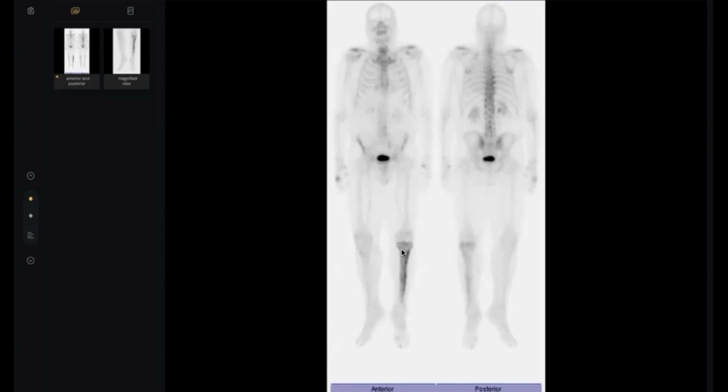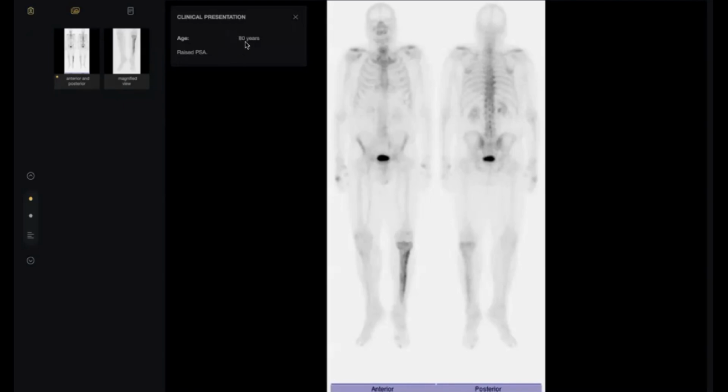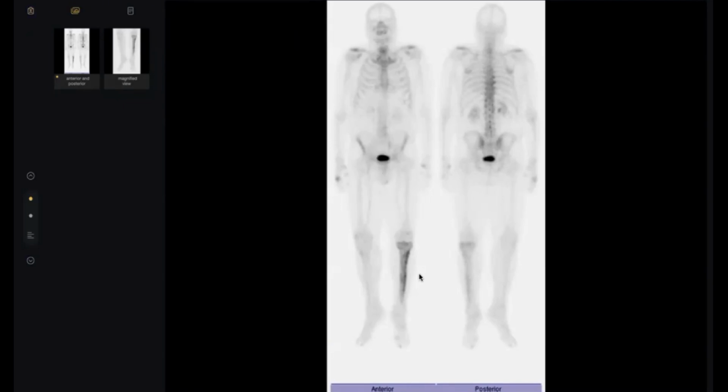Do you think the infection will draw the tibia like the normal anatomy? No, this is number one. And you forget the history. It is an 80-year-old patient. So given the involvement of a single bone on the left side, I am thinking of Paget's disease.